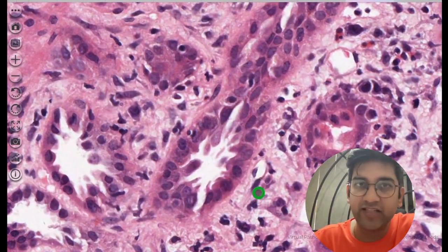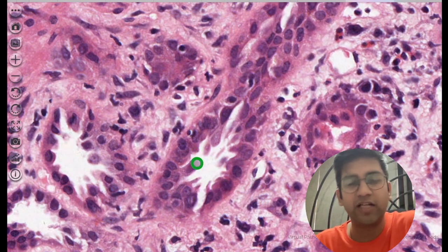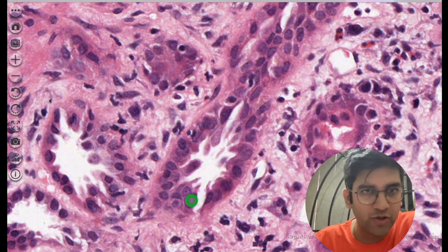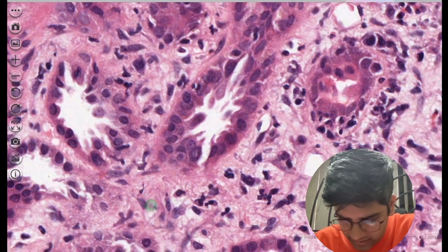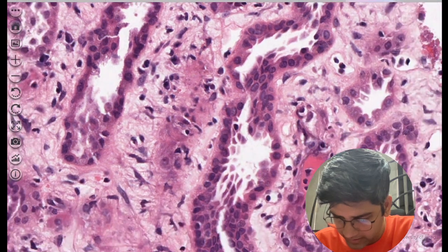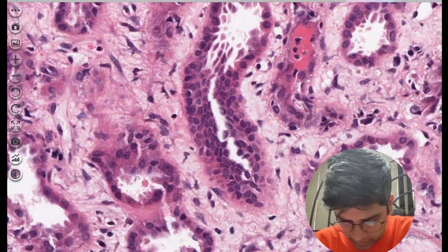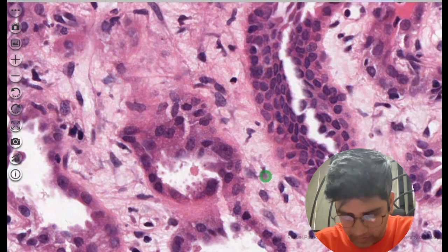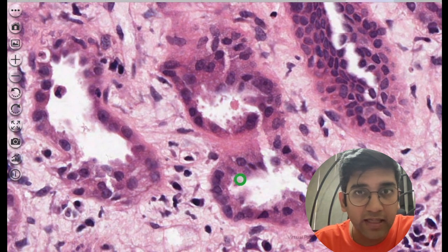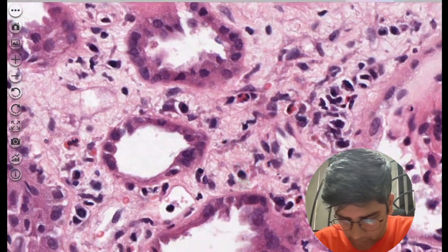First thing, it's definitely hypercellular. You must have seen multiple normal kidney biopsies by now. There's definitely a good amount of anisonucleosis, and hyperchromasia is there. And if you zoom in further, even at this power, let's scan through, you will definitely find inclusions. Look at this. A basophilic granule there. Yes, definitely. That should raise a suspicion of polyomavirus nephropathy.